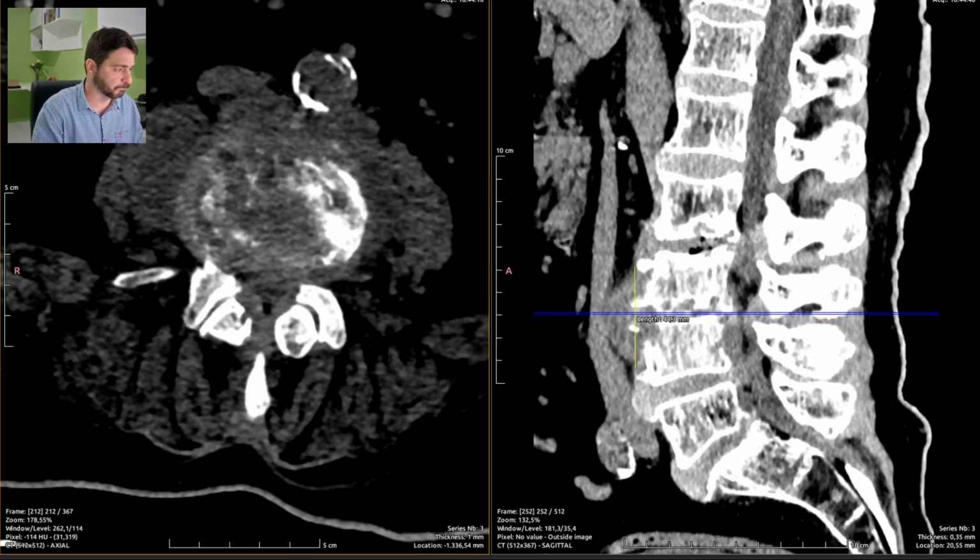So let's summarize the report to make it easy for reading. Bulging discs.